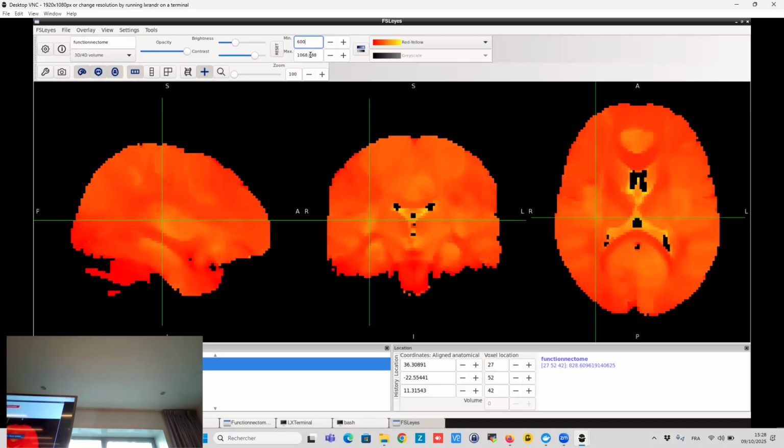But do we still get voxel values for the gray matter? Yes, it's really small. Or like we put the gray matter mask, that is only to extract the values of the white matter. Yeah, it has values for the gray matter. So we were discussing that. It's why if you look at the size of the image, it will be much larger, because it adds the signal from the gray matter to the white matter. So you have both.